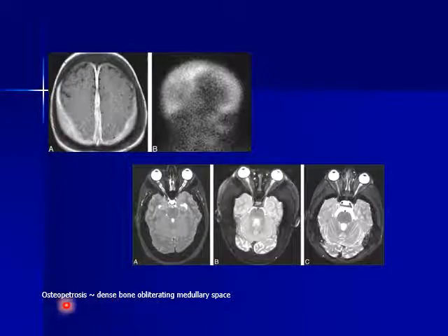This was a patient with osteopetrosis, okay, where there is replacement of the marrow spaces by the abnormal bone, which indirectly causes failure of formation of the blood elements by this marrow, and expansion occurs additionally due to the anemia, and extramedullary hematopoiesis may be accompanied.